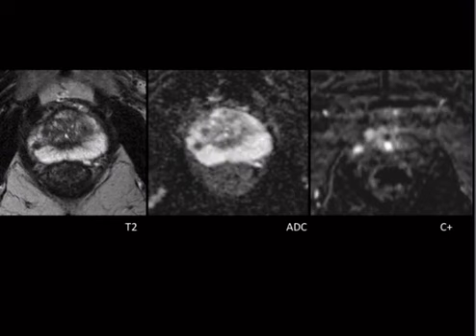Now let's have a look at this study here. If you notice, there is a black thing on the right side in the peripheral zone with corresponding low signal on ADC. Now, why don't they show the diffusion? Because the peripheral zone is T2 hyperintense, so you're going to have shine through. Unless they want to show you both diffusion and ADC, you just look at the ADC for the dark thing; the diffusion's not that helpful because of how much shine through you're going to have. And then typically post-contrast imaging is shown as a subtraction.